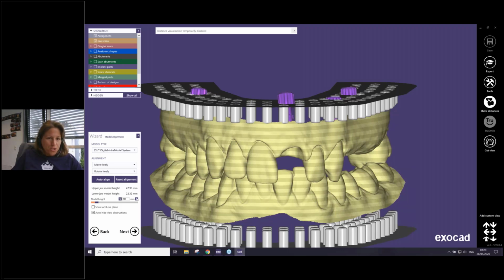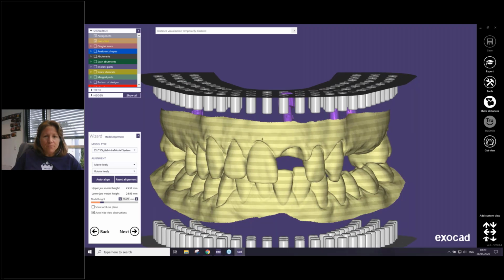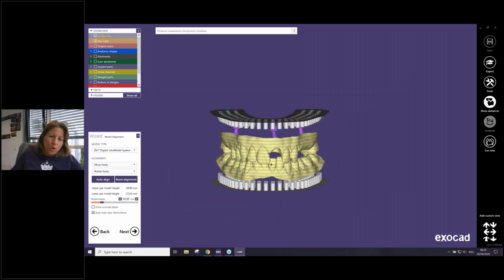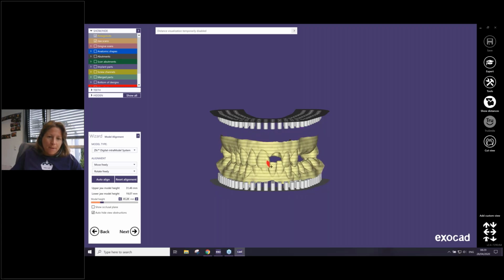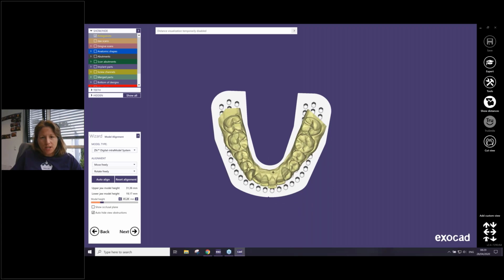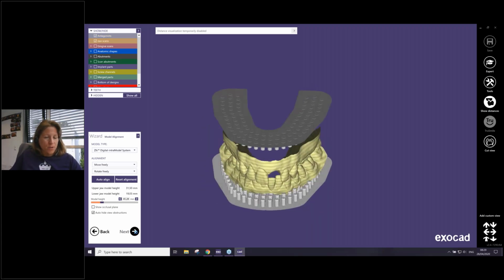So you have two options. One is to change the height in totally. And the second option is to move the model a little bit further down. And if the analogs are hidden, you know it will fit into this model or in this type. So here we'll change it a little bit. Okay, this is correct. We can continue.